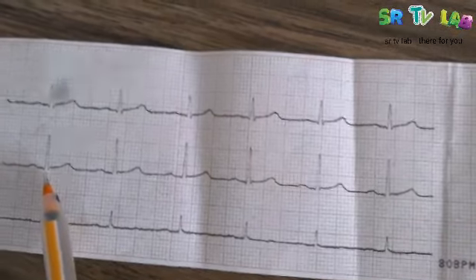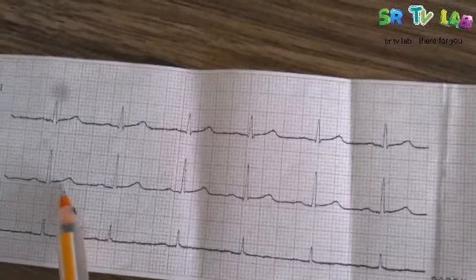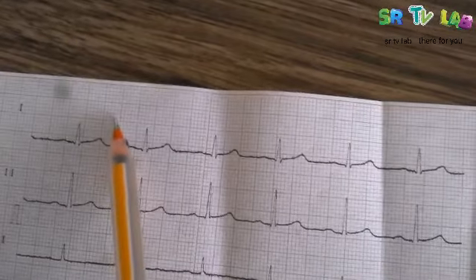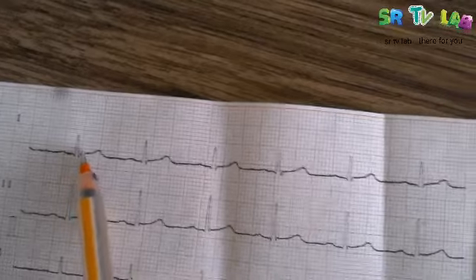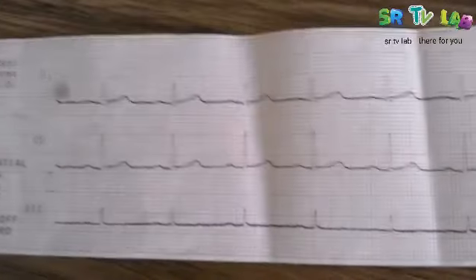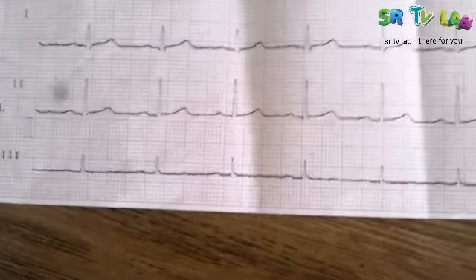to the beginning of T wave. Do you get me? So it's from here to here actually. Okay, good. When you look at the other, it's from here to here. Look, now there is a normal duration of every part we have said.